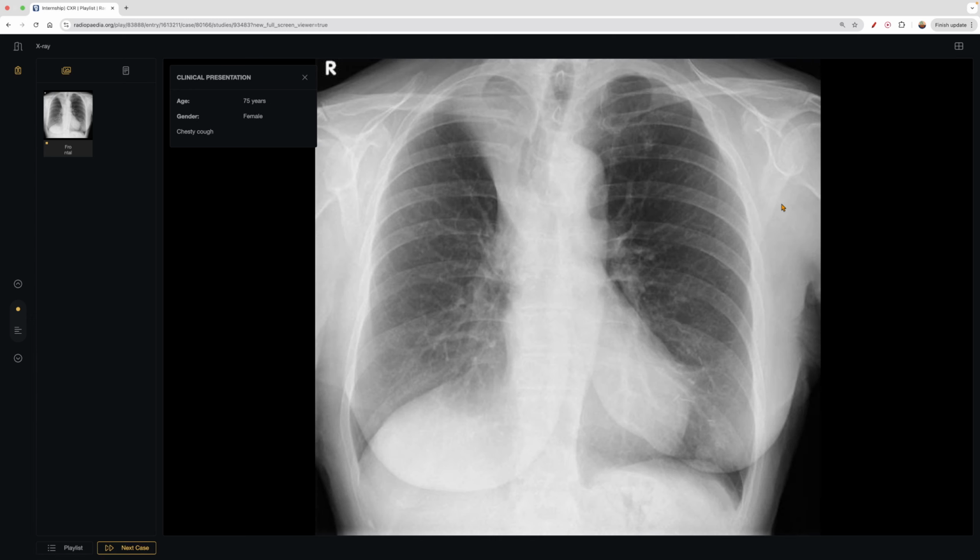So quickly here, we see the lung, look at the bones, come back down, looks fine, come back up. You see here, and then as we go across here, we see that there's something here. There's an opacification. Again, I'm always going to say that word because you can't go wrong. So there's this opacification, and we do see that the trachea is a little bit skewed, but this opacification does not look like pneumonia. There's no case of pneumonia where we see that it was very vertical, right? It's very weird.